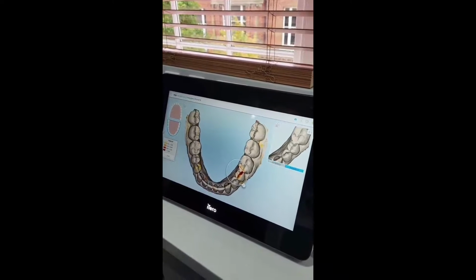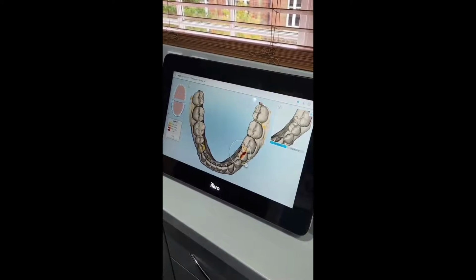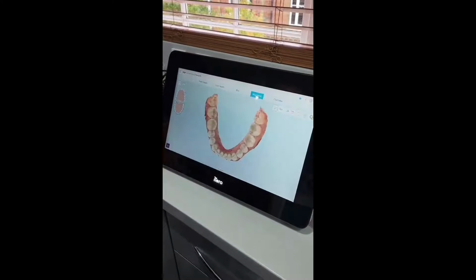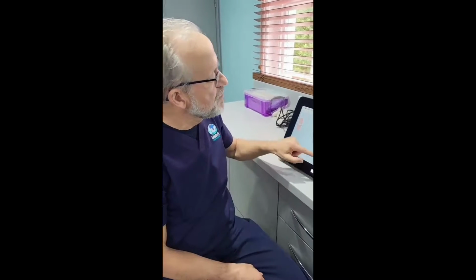So it's automatically flipping between the two, and you can say to the patient, yes, your teeth have moved in the last year, 2 years, or whatever it is, and they've moved roughly 0.2, half a millimetre, whatever it is. So it's giving the patient clear information about what's happening in their mouth. And this is really to be used as part of the ING conversation. Remember that, Mrs. Jones, your teeth aren't crowded, they're crowding. Your gums aren't receded, they're receding. Your teeth haven't cracked, they're cracking or wearing. It's all helpful so the patient understands the dynamic changes that are going on in their mouth.